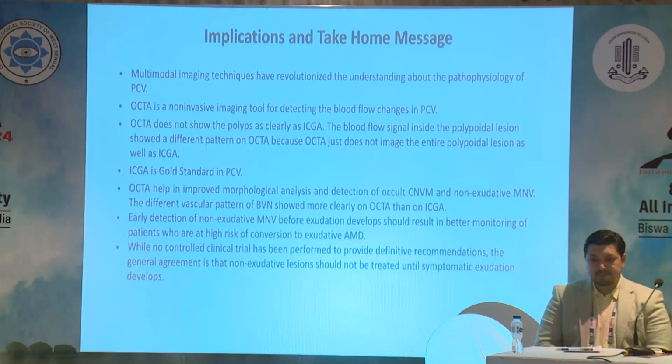And for MNVs, I think OCTA has really helped us improve the detection of occult CNVs, non-exudative MNV, without any invasive, and a very fast procedure. And these membranes have to be observed over time, and there is no need to treat them if there is no activity. So thank you all for listening.